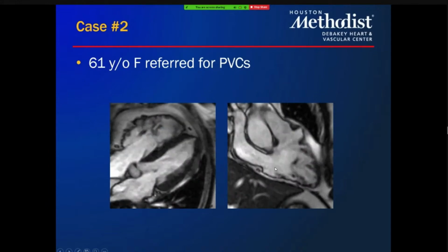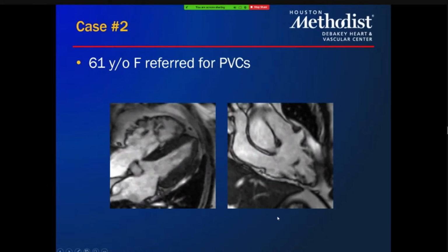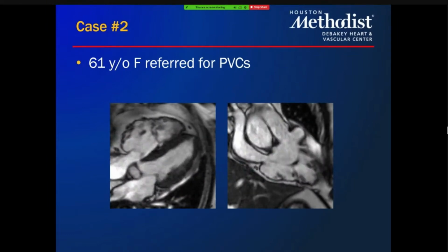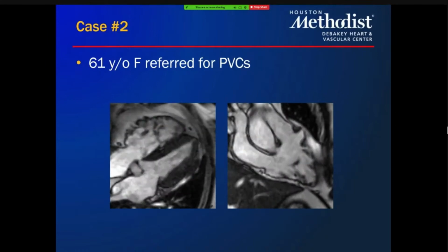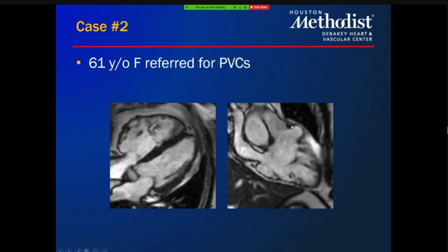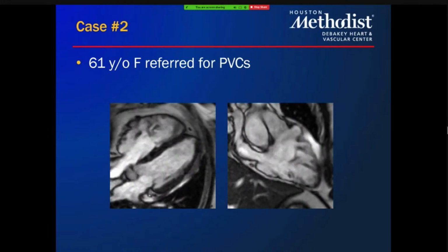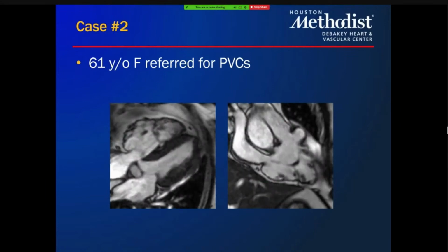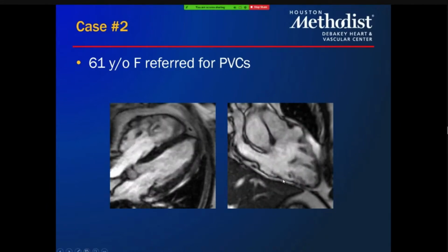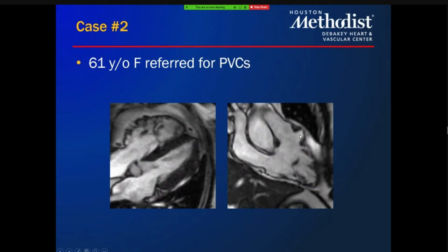And then, Amr, what do you think of the anterior RV? So the anterior RV also does have a hypokinesia actually. What about this? You see my mouse? Is that a dyskinetic segment of the RV? Exactly. Yes, dyskinesia. Remember, we had a discussion the other day about hypokinesis, akinesis, and dyskinesia. You clearly see when the RV is contracted in systole, this portion actually gets bigger compared to diastole. Correct. So this is true RV dyskinesia.